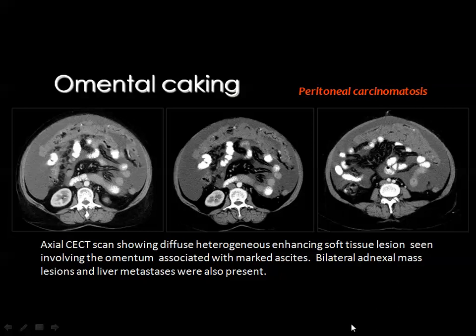This is known as omental cake, and it represents omental deposits, mostly from ovarian malignancies, but this omental cake may also be a presentation of metastasis from other intra-abdominal primaries, especially in the colon.